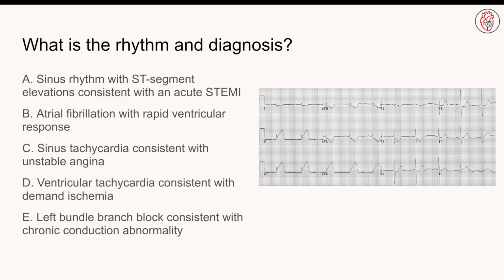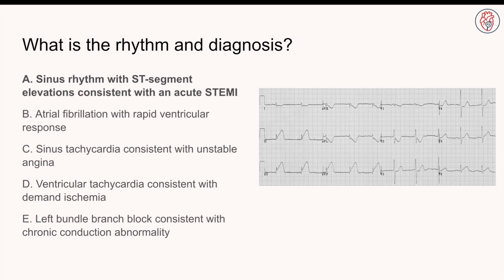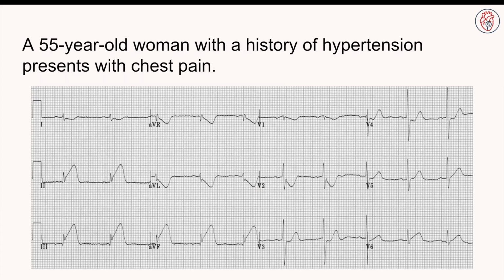Now tell me, what is the rhythm and the diagnosis? Yeah, hopefully you got sinus rhythm with ST segment elevations, consistent with an acute ST elevation myocardial infarction, or STEMI. Okay, let's go back and look at it, okay?